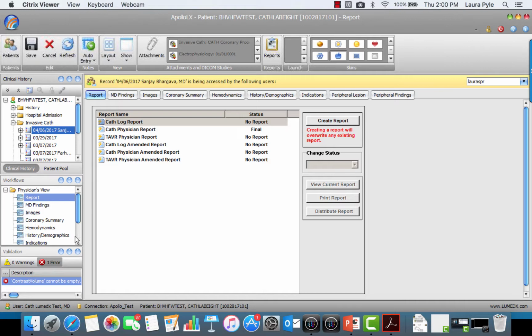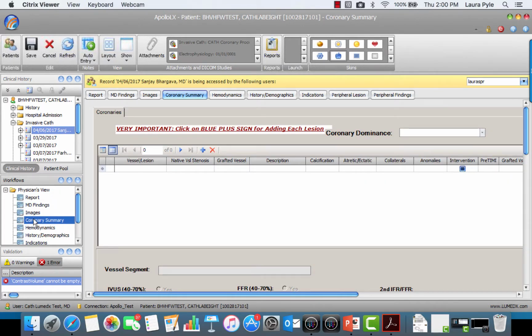When a workflow is opened, the tasks for that workflow display in the Workflow panel. A task is a step that you complete as part of a workflow. Each task corresponds directly to a form that is filled out. If you double-click on one of those tasks, the corresponding form for that task will display in the Forms area on the right side of your screen. You can also navigate to a different task by clicking the corresponding tab in the Form area.